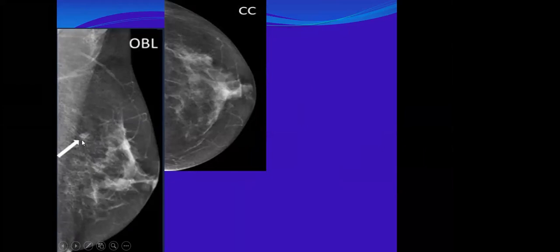Yes, it can be. From here I can suspect. I could appreciate the medial, the posterior medial aspect, but part of the lateral aspect is being cut. So I can do straight lateral, or I can do what we described before. And usually on the CC view, the area expected not to be included is superior and lateral.